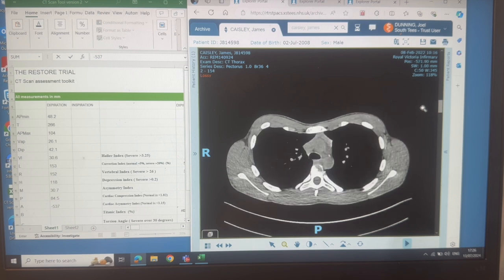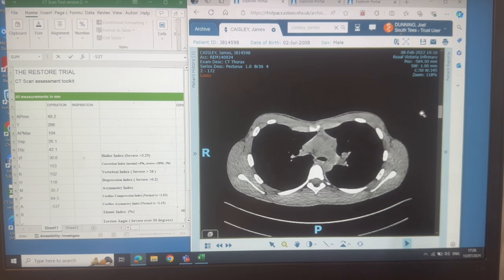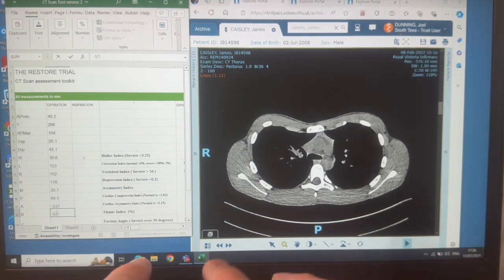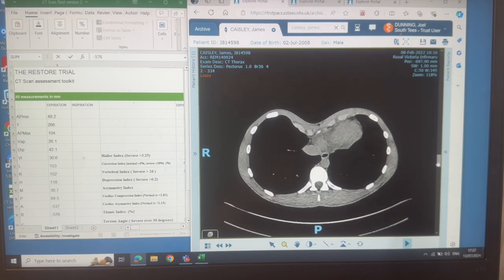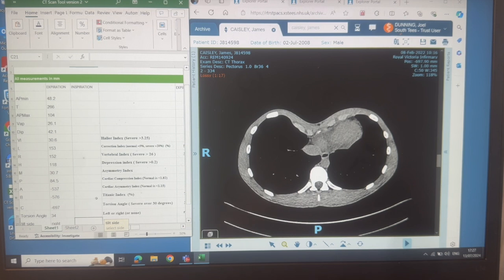Certainly a dip there. And again, if it's below the sternal line from quite early, that's certainly starting to be below that line, then just do it from whatever line you like. So this is point B, minus 576. And then you want to get the bottom of the xiphisternum, not the bottom of the sternum, the last bit of bone. That's the last bit of xiphisternum, minus 697. So I have found some are in minuses as well as pluses.